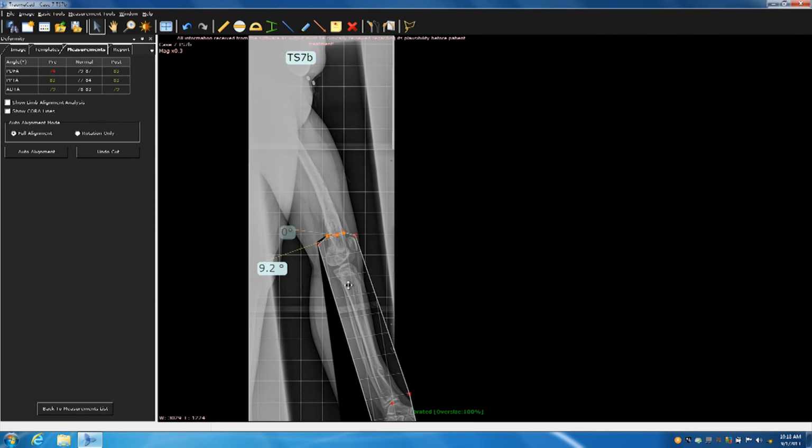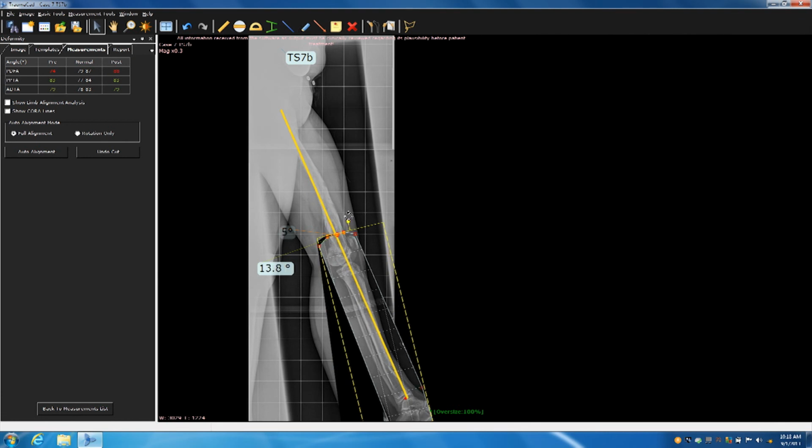If you really feel wild, you can do a double osteotomy in the tibia and correct that if you think that's a problem. You can also grab your line again and pretend you can see the femoral head, draw down to the ankle and say, hey, I'm just at my hinge point. I'm still kind of worried, so I'm going to correct her a little bit more into extension and make sure that she can lock her knee during gait.